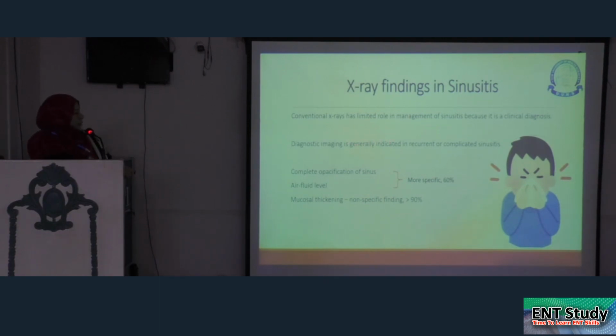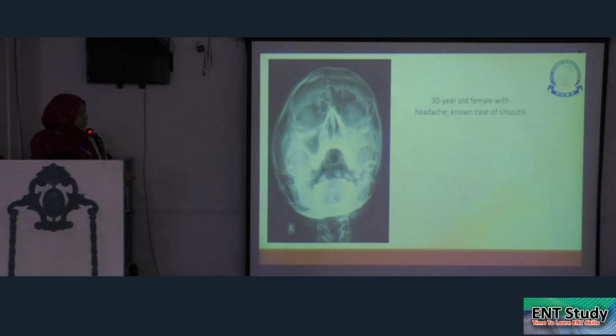The conventional X-ray has a limited role in the management of sinusitis because it is a clinical diagnosis, but imaging is generally indicated in recurrent or complicated sinusitis. On the X-ray, either we see the complete opacification of a sinus or an air-fluid level, which are more specific findings but seen only in 60% of the cases. While the mucosal thickening is seen in more than 90% of the cases, this is a non-specific finding, so it should be interpreted with clinical correlation.